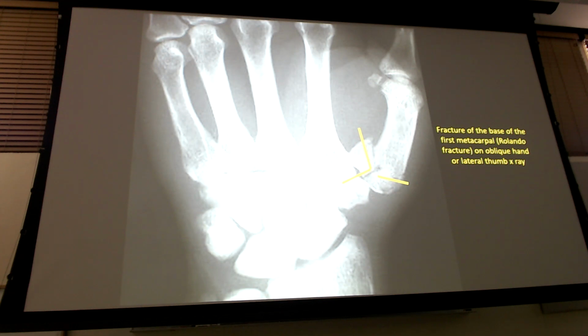Rolando. Now I'm going to take away the old lines. I know on your slides you don't have them, but I'm going to take them away. Do you see the three pieces? Two are very obvious, there's one, right? But then when you follow the cortex down, I got a break in the cortex here, a break in the cortex here, and whenever you have breaks in the cortices, then you're going to start looking even more in that medullary area.